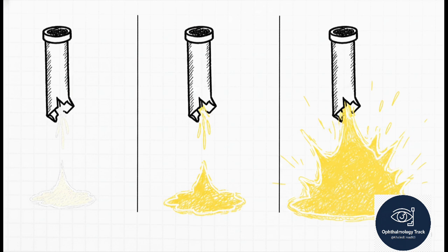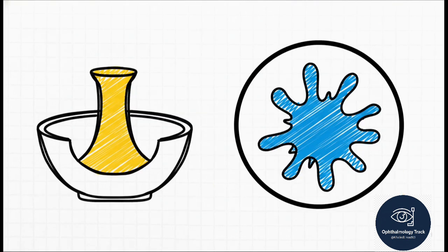In a classic CNVM, or even with neovascularization elsewhere on the retina, you'll typically see an initial lacy pattern of hyperfluorescence. But as the angiogram progresses, you have to watch closely. That bright spot progressively enlarges in size and massively increases in intensity. It starts glowing almost like a light bulb. Plus, because the dye is freely spilling out into the surrounding tissue, those margins are going to look remarkably fuzzy and ill-defined.